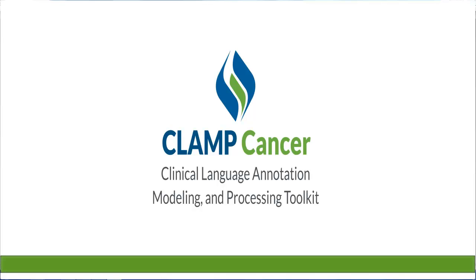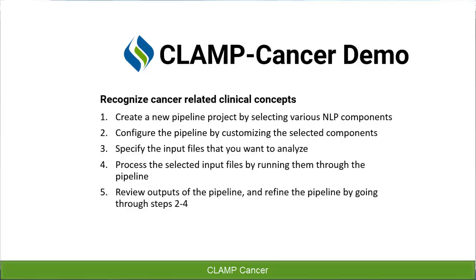Here, we demonstrate how to build a customized NLP program for extracting primary site, histology, biomarker, and tumor-grade information from pathology reports using CLAMP Cancer. To build such an NLP pipeline, we need to follow these steps. First, create a new pipeline project by selecting various NLP components.